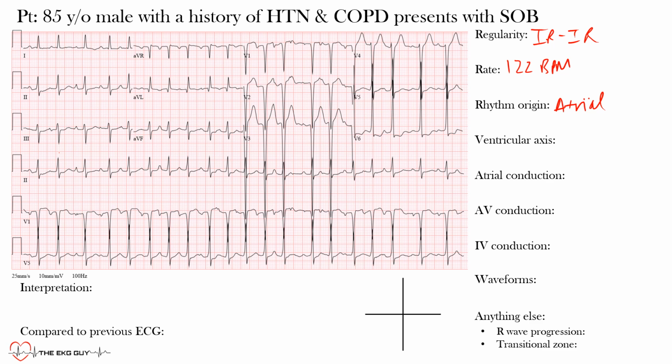Let's look at the ventricular or QRS axis, okay? And you should have gotten a normal axis, so this is actually normal. We'll go through why that's the case, and it actually came out to -2 degrees, okay? So what you need to know here is that 0 degrees sits here. This is where positive 90 sits, okay? This would be positive 180 degrees or minus 180 degrees if you went the other way. So that's where minus 90 degrees sits.